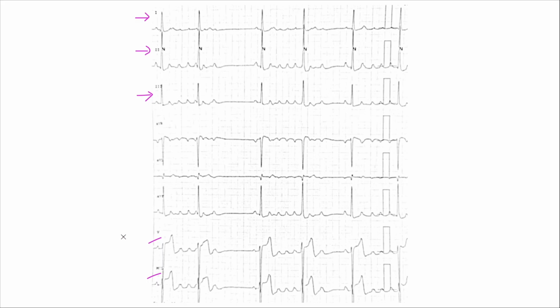But sometimes the unit itself will do kind of funky analysis. And even though it's positioned at, for example, lead V4, it might be trying to analyze V5. But a good rule to follow: take a look at the patient, see where that V electrode or MCL is placed. They should be labeled as such. And you should get an idea of what it is that you're looking at here, okay?